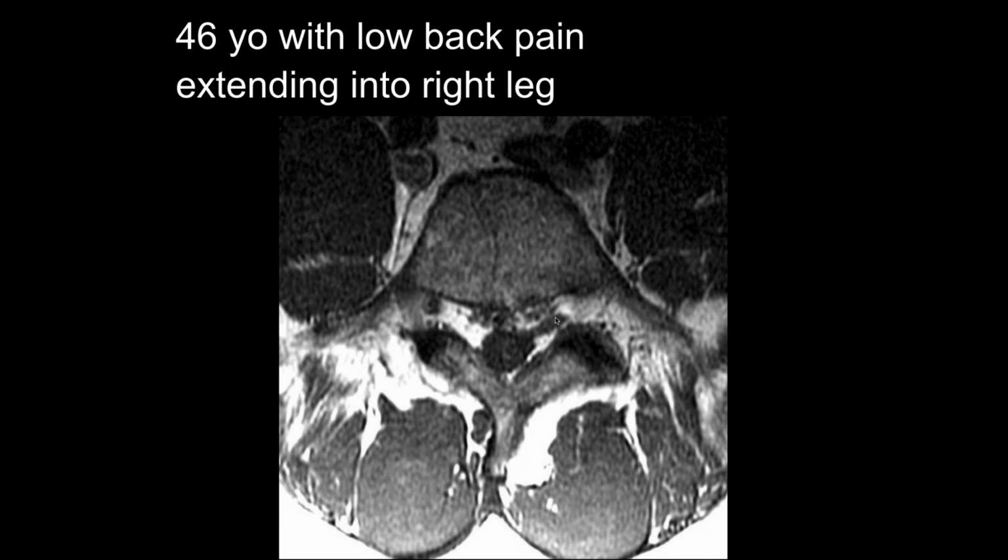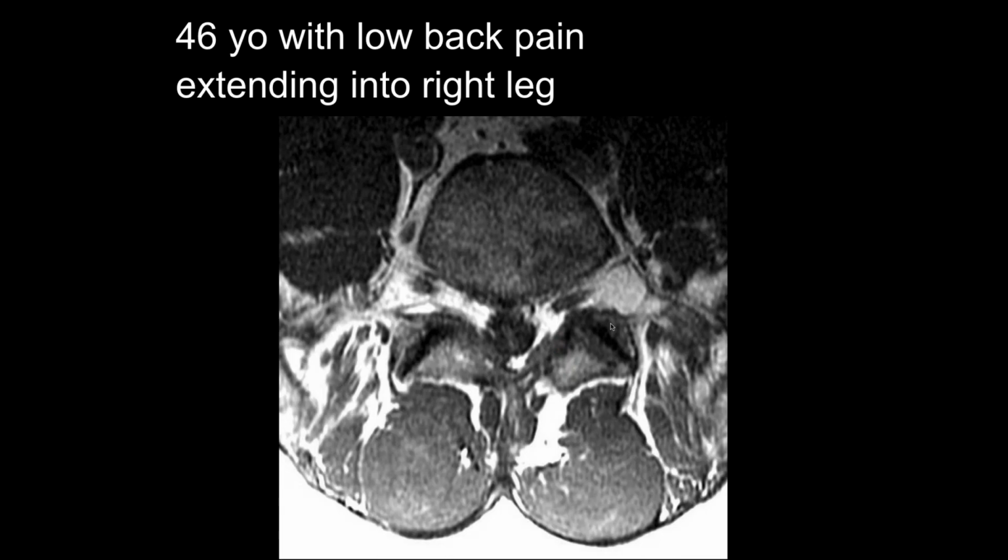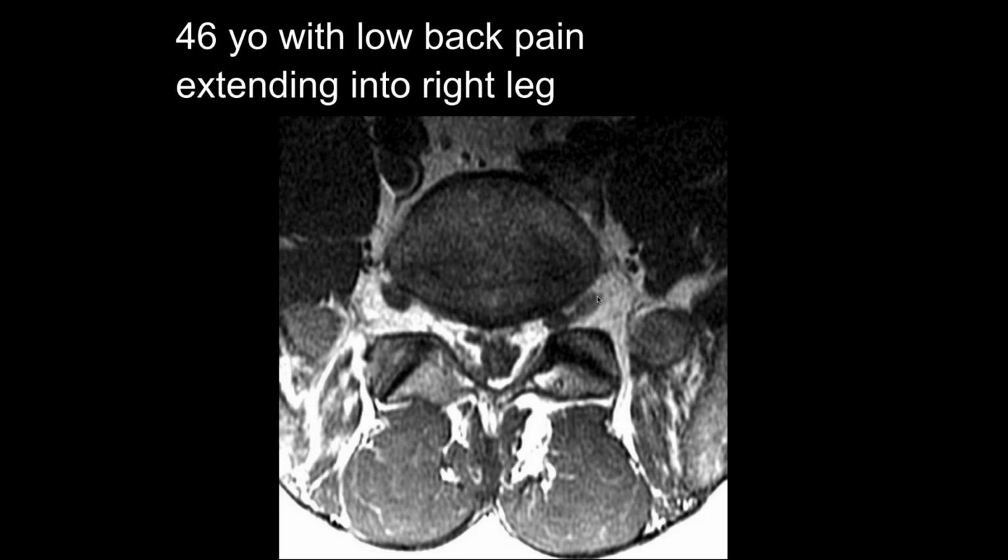And here we've got both the L5 and the S1 roots together on this side. Here the S1 root is in here, the L5 root is out there. So they're kind of held together. And here, though we don't really see it right now, this is the L5 root, the S1 root's starting to bud off here. The S1 and L5 are together here. The next cut down, there's the L5, here's the S1 coming off of it.